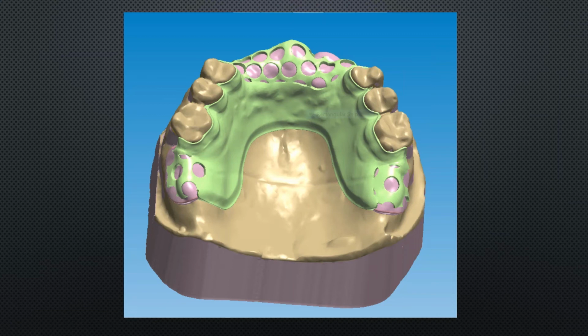Well, we don't have to worry about that because we want acetal, the whole thing, to have no texture. The reason we put texture in metal is mostly just to break up the reflection of light. We don't want a mirror in there that's gleaming back at people when you yawn. Well, with the acetal, you don't have that, or with the VisiClear as well, you don't have that. It's a nice material that blends in, you hardly even tell it's in there. So we want it smooth because that'll be smooth to the tongue, less stains being able to attach themselves to the texture. And so all you have to do is just mark everything and then skip that secondary marking.